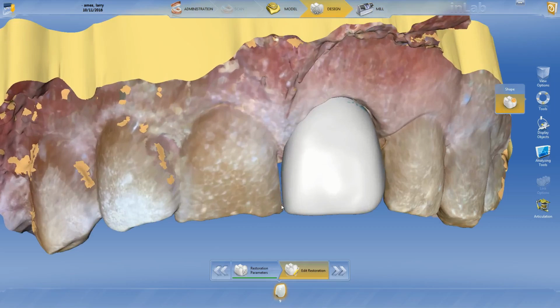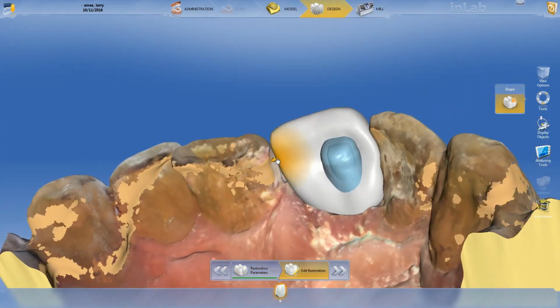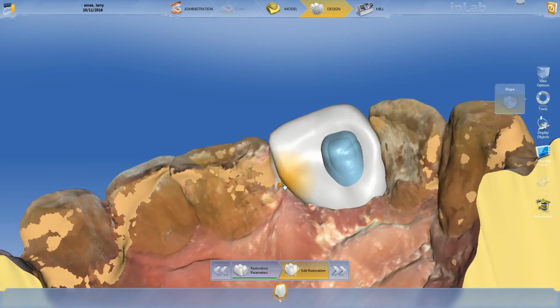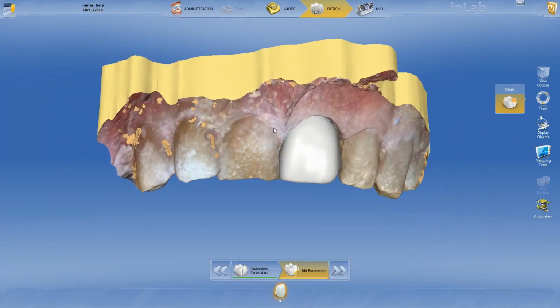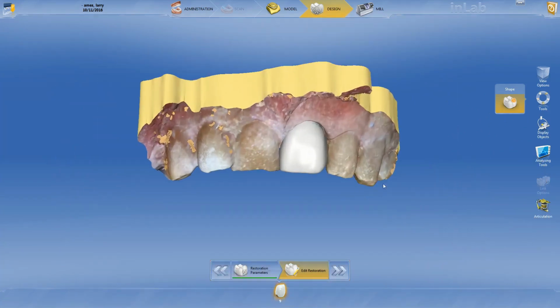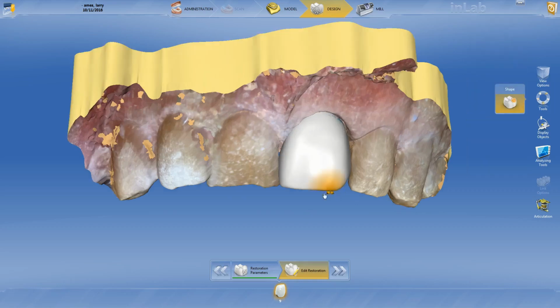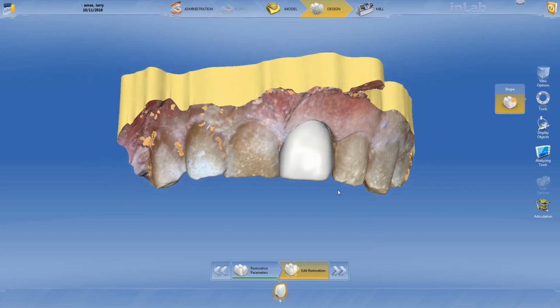And then as far as something like this black triangle, you'd fill that in the same exact way. You would bring it back lingually. And that's as far as I would take that. But if you do have that round edge, take 4-directional circular, and I've showed you this trick before. Just bring that over, and now you've got a sharp incisal edge right there.